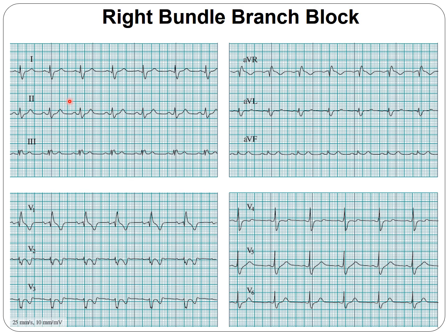Looking at this graph, we have rhythmic heartbeats. The rate is around 75, 80, for example. P wave is present, so it is sinus rhythm, and PR is normal. QRS is wide, and the axis is around 30 degrees or so.